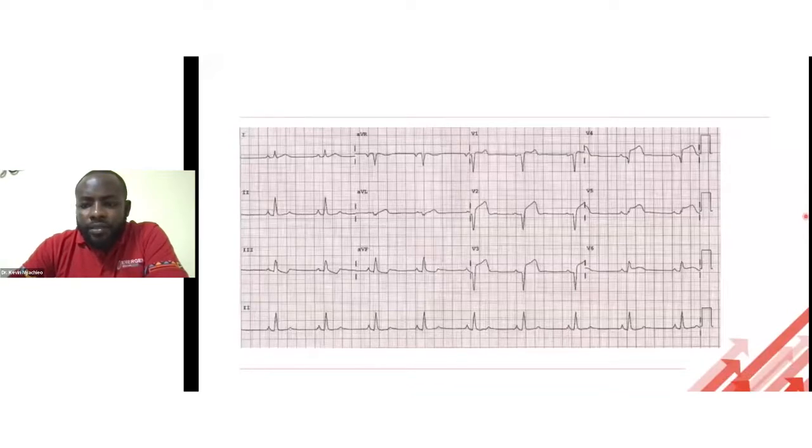Okay, anterior septal MI. Why is that? STEMI, anterolateral STEMI. So the general idea, I think everybody is getting it. We are getting a STEMI.